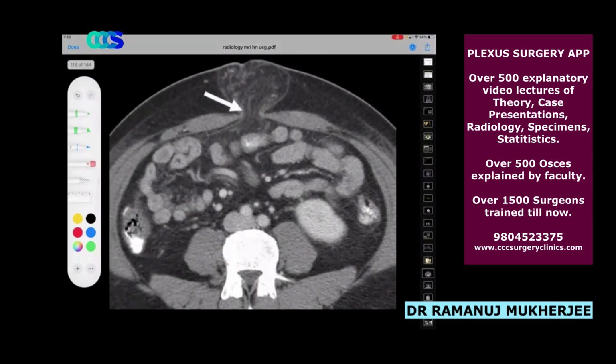So guys, what is your diagnosis from this one? Umbilical hernia. Ventral hernia. Very good. You can see very quickly an umbilical hernia. The mushroom is very evident. What is the content in this hernia? Mesentery. Very good.